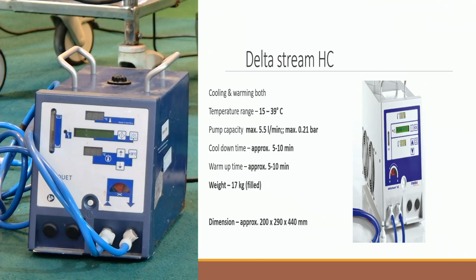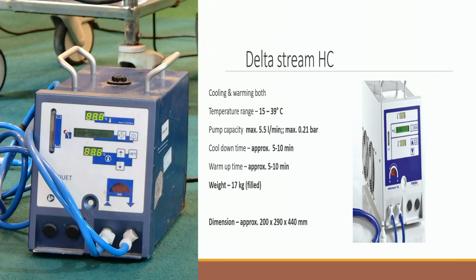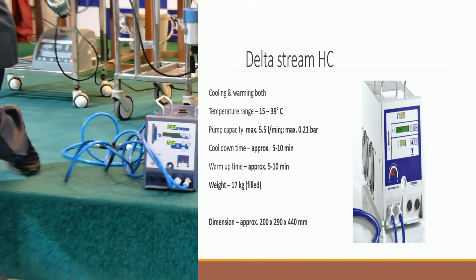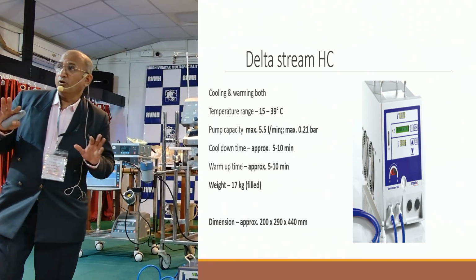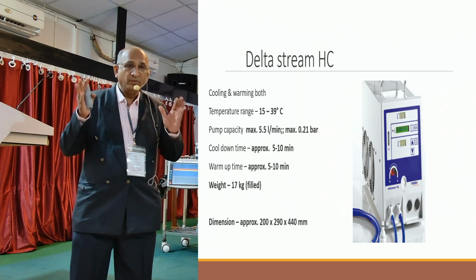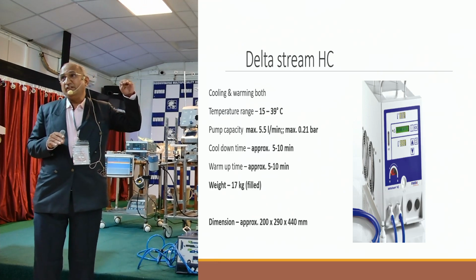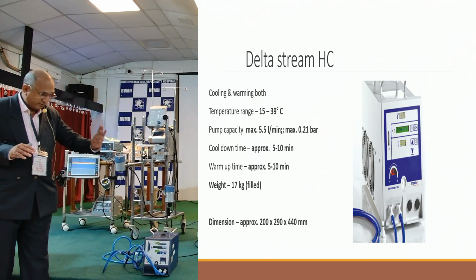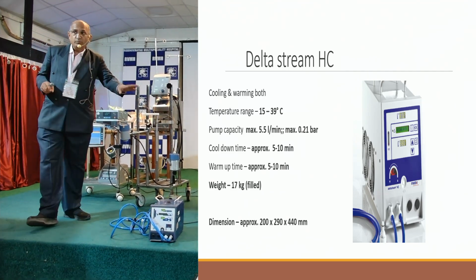Okay. So ideally speaking, both the temperatures should be the same. In case your heat exchanger is malfunctioning, you might see a difference in temperature, or if the patient has a fever. When the patient is on ECMO, fever may not be a proper sign, because you are cooling or warming the patient. But if the patient's temperature is more than 36, the monitored temperature will go up. That suggests the patient is having a fever. Okay, so this is to warm the blood.